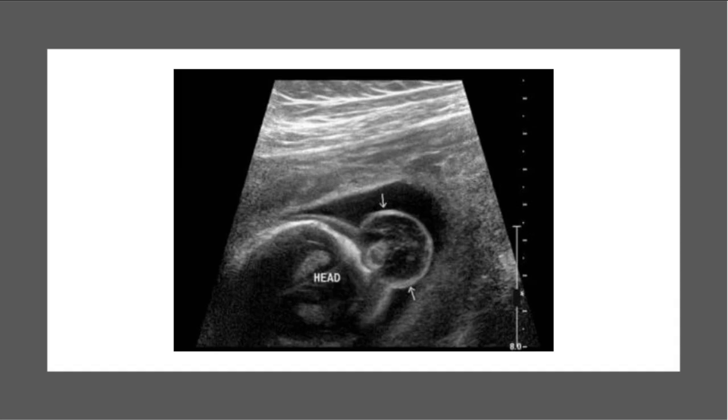Continuing on with that train here, oh, here we have a picture of what that solid brain matter would look like. So that classic encephalocele, we can see that that is coming off of the occipital region of the baby's head. So this is going to be of a Western prevalence. You can see we have this cystic region here. So that's probably going to represent some cerebral spinal fluid from the meninges. And then we also have this echogenic brain matter or parenchyma coming through.